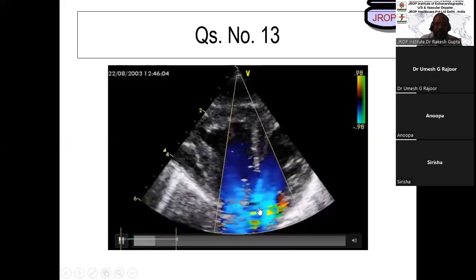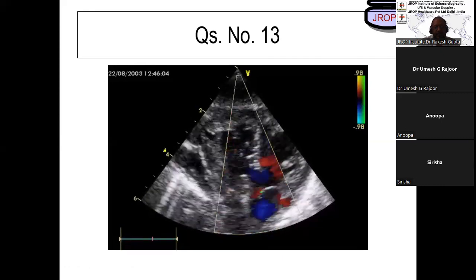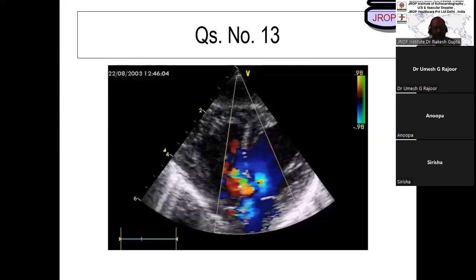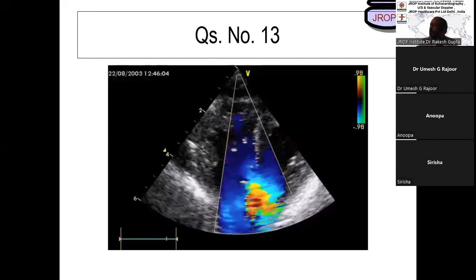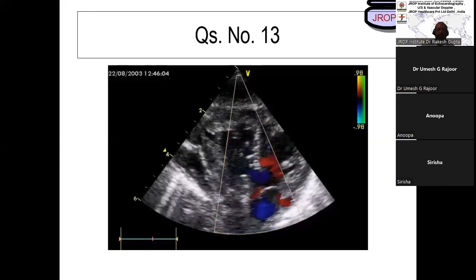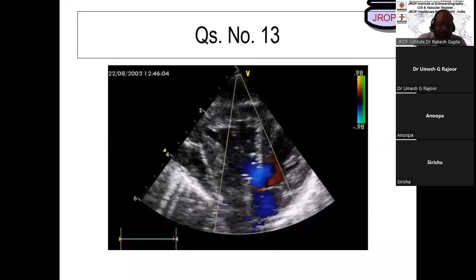Then you can see what these two are. Both RA and LA. No, they are not RA, LA. Make an attempt. You are able to do a good job. I'm not going to ask you a next question. I'll not give you any marks for this, Raju, but would anybody like to attempt?